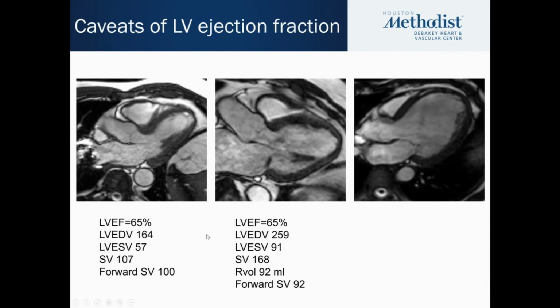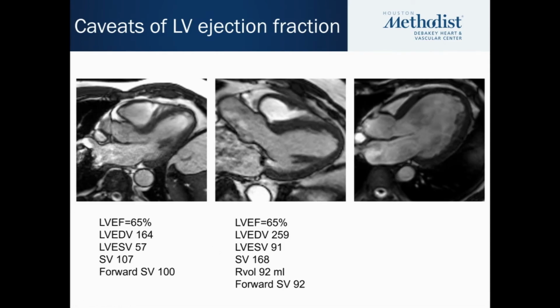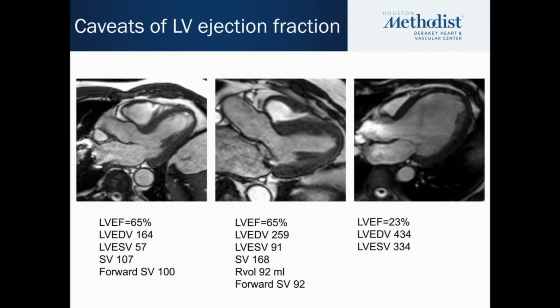Now let's look at this heart. As you can see, there are regional abnormalities. You can tell there's been a previous infarction in the LAD territory.